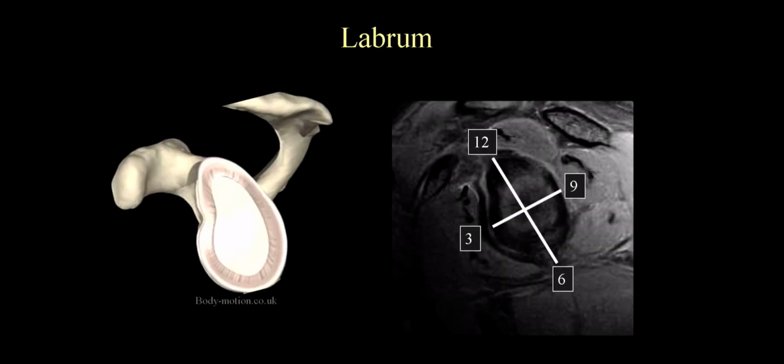If you look at the glenoid fossa, you're trying to look at the clock position, and depending on the surgeon, it's different. Some surgeons believe the anterior shoulder is going to be at the 3 o'clock position, whether it's left or right. Some surgeons will look at the shoulder from the side and say that's the clock position, left or right.